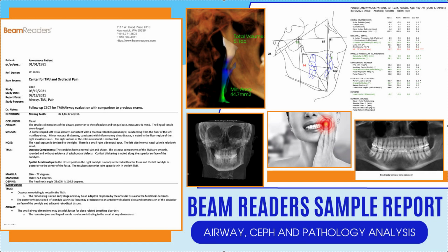So they did send me one sample report with some x-rays so you can kind of see what it is. This patient really didn't have a lot going on, so I was kind of looking for one that had maybe some pathology or some other cool stuff. But you can see here, it doesn't quite have that much exciting stuff, which is a good thing for the patient, right? But this is the only one that they could give me. So I kind of want to go over a little bit about what you're looking at, what it looks like.